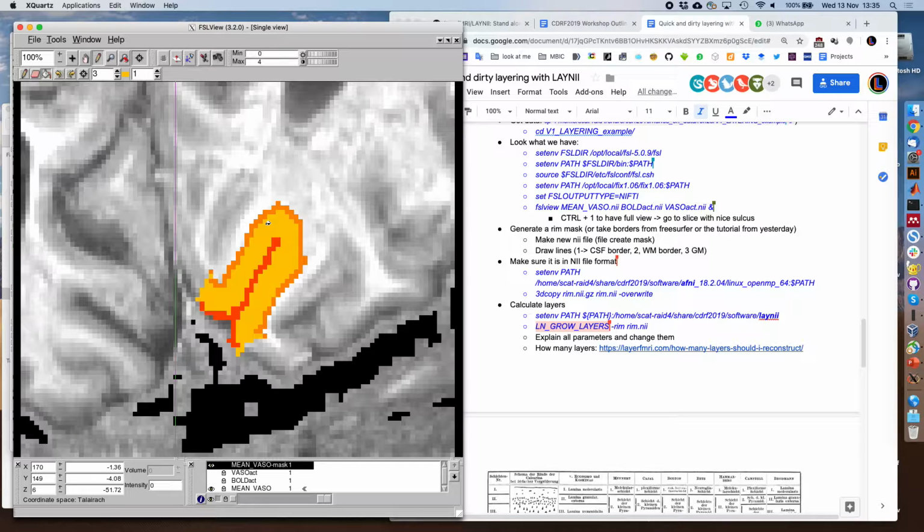Does anybody have problems or questions? So if I want to do multiple slices, I can also do it? Sure, obviously, of course. The algorithm is in 3D. There's a flag later that if you want to do it in 2D only, you can.